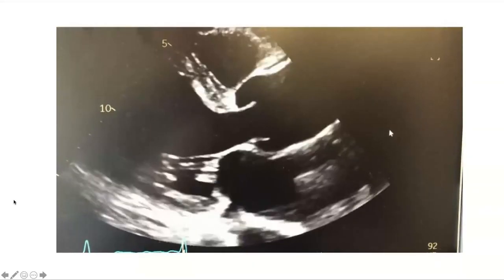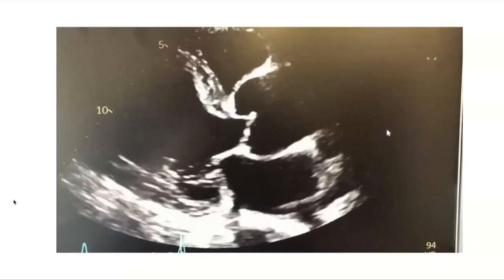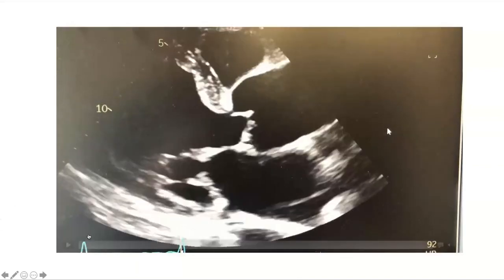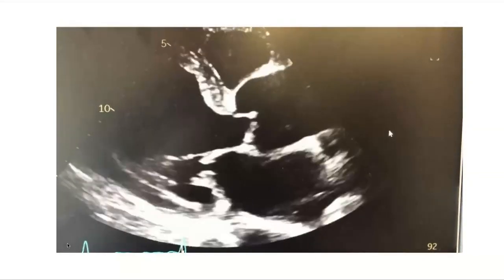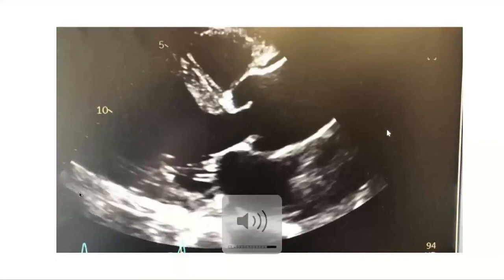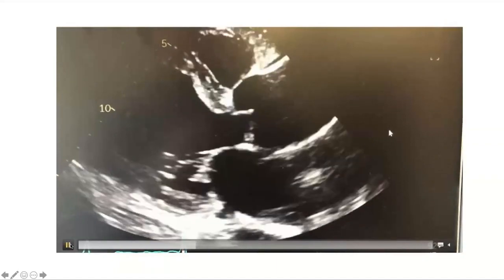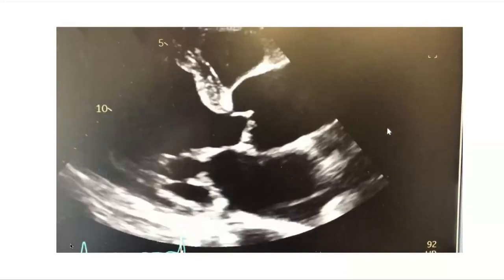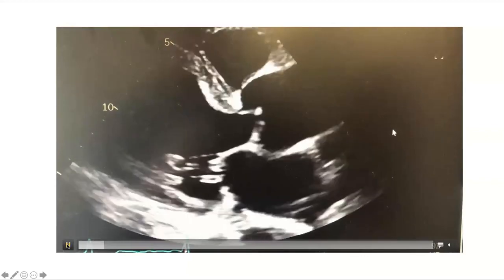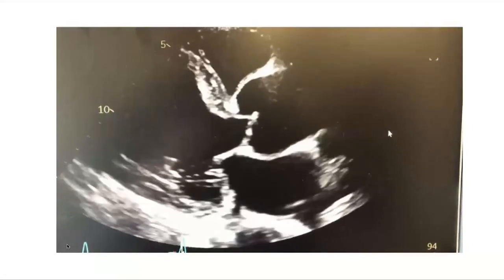Oh, thanks, Anna. So you're presenting a parasternal long axis view, which is zoomed in. And we can appreciate that, as we look at chamber size quantification, there's some prominence of the proximal aorta. We need to do proper measurements, but the sinotubular junction just looks quite large, and there's not a great distinction between the sinus of Valsalva, the sinotubular junction, and what we see of the more distal aorta.